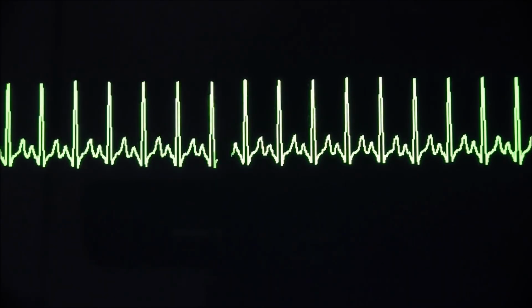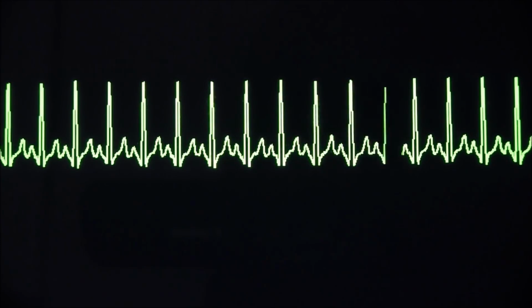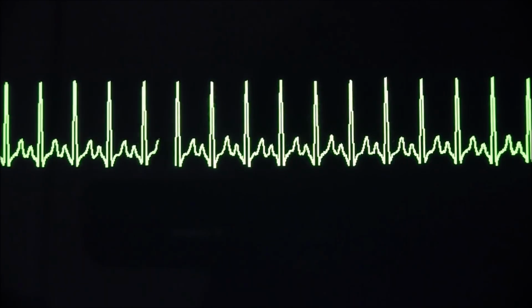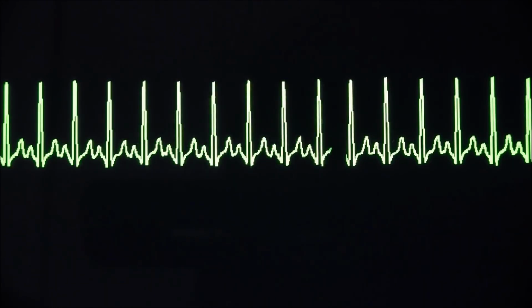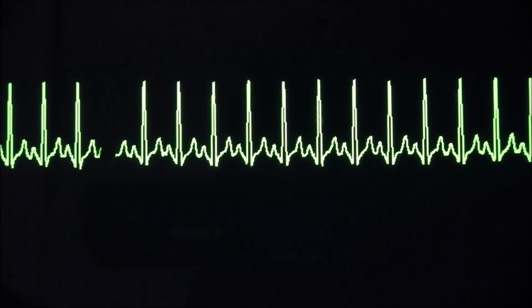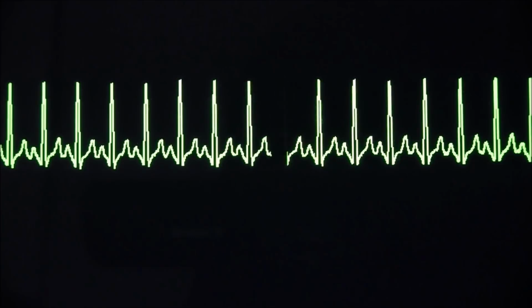So they're the only 3 normal heart rhythms: sinus rhythm between 60 and 100, sinus bradycardia less than 60, sinus tachycardia greater than 100. And of course this sinus tachycardia would be perfectly normal if you're out running, for example. It depends on the situation and has to be interpreted as to whether it's a physiological tachycardia or it's symptomatic of some underlying pathophysiological derangement.